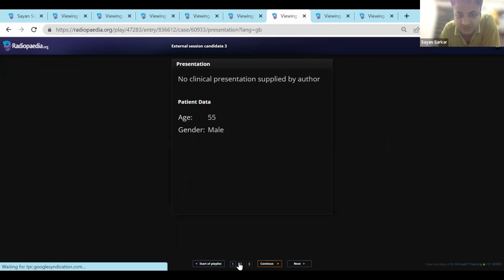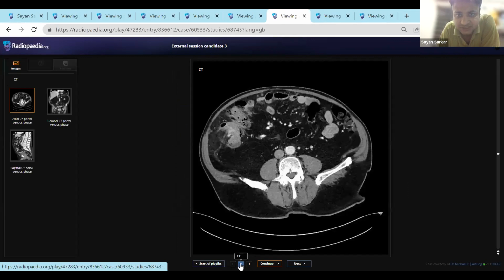And this is which case? This was your first case, I think. Yeah, this was intussusception. So yeah, I was looking for polyps. Okay, so polyps are a very common cause of intussusception. So whenever you see intussusception, you have to think about polyps as a possibility.